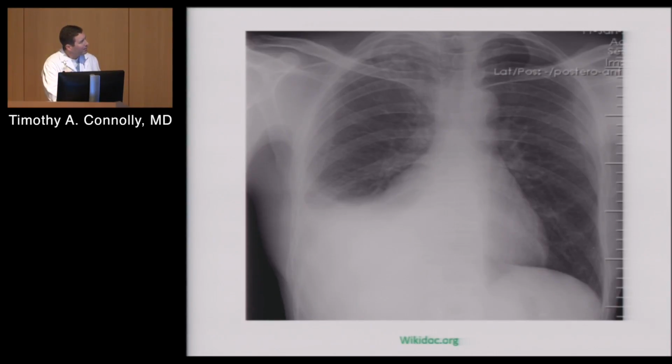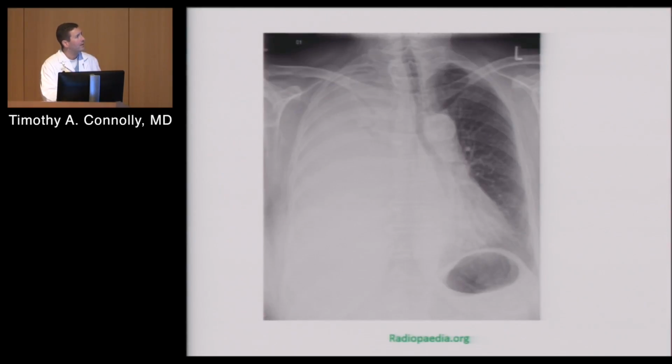This right here may be a small rim. Do you see that single line? That may be some atelectasis, but the rest of this you really have to just assume is fluid. This one, even less obvious, unless you get the clinical story. And this is the one where it really is almost impossible to hurt them by doing a thoracentesis.